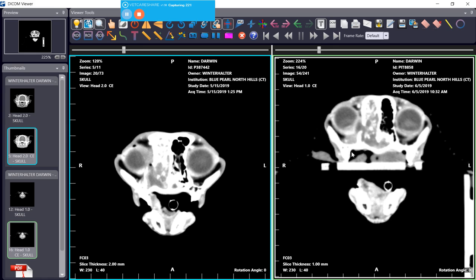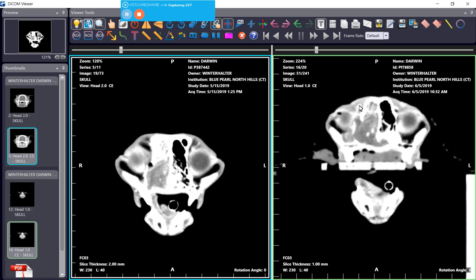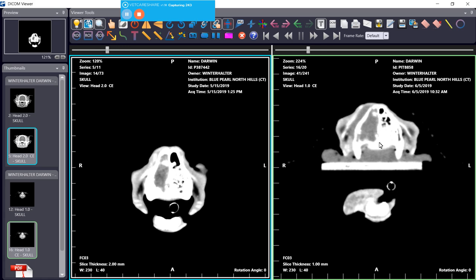Now, what I do notice very quickly as we move forward, and again, we're off a little bit, is that we are seeing some more swelling out here, more swelling beneath the eye. This is the eye, and so this is into the orbit. Normally there's a thin bone here that the tumors will erode through, and again, that's very similar to what we're seeing in him. So again, just a little bit more tissue up in that nasal area. The other big thing that we're seeing as a difference is, look at the left side again. The left side of his face, I'm sure, was quite normal at the time he was done May 15th.